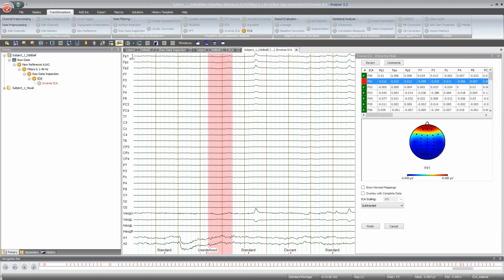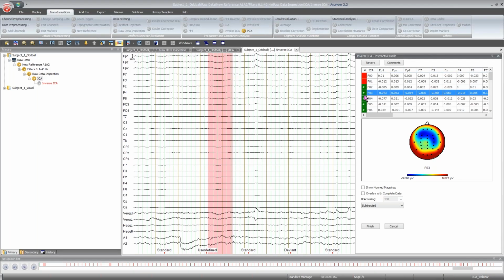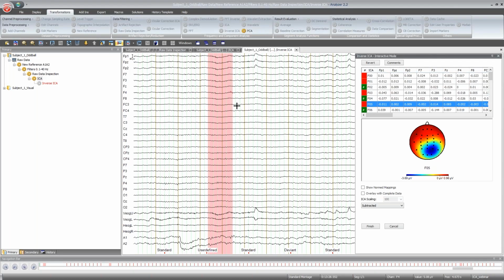You can see this and also the correction before projects back to the channel data. Be careful though if you use this mode, because if you tick more than one, so I check all one, that and that, and you see it changes. So this shows you always the summed up effect of all removed components. So it really depends on what you are looking for.